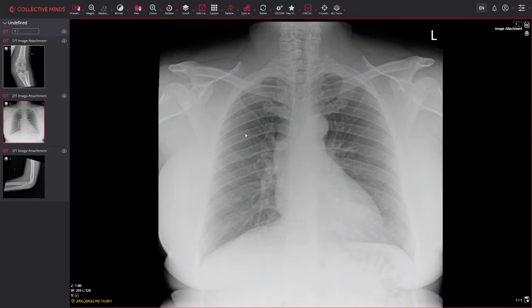But we can see we've got no consolidation. The lungs look nice and clear. The markings look absolutely fine. The mediastinum looks good. The heart doesn't look enlarged. We've double-checked those 3 areas to make sure there's no tumours hiding in there. Obviously, I've talked about the cyst there. Then we'll have a look at the bones, okay?